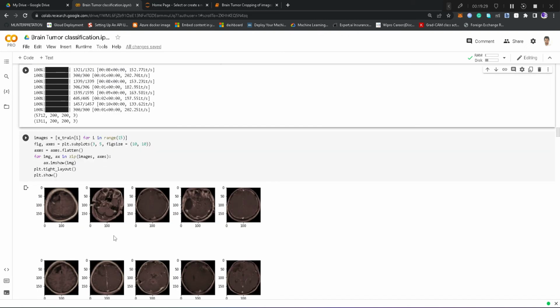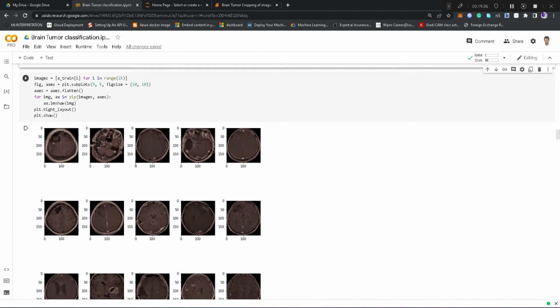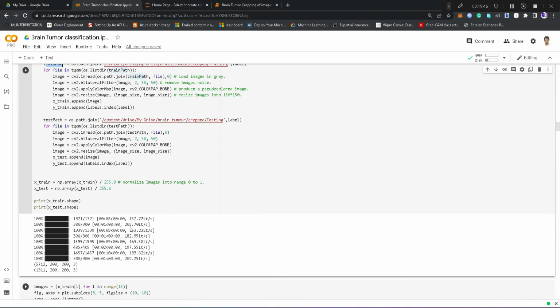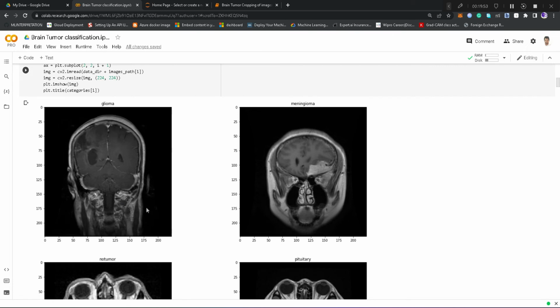Why did the color map change? Because after seeing this image you can understand that these are the bones, and the bones will be highlighted. That makes it easy to get the actual pattern from the image. While this one is quite plain, and sometimes dull.